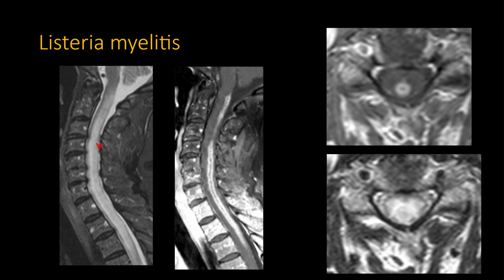In this particular case, you can see longitudinally extensive myelitis involving many vertebral body segments. There's involvement of the entirety of the cord. But here, this is actually a case where I thought that the central cord was more pronouncedly affected on the hyperintensity, almost mimicking the H sign. So you see, this is what the H sign would look like. You would have this H, the different legs of an H here. That being said, the enhancement is not following the H sign at all.